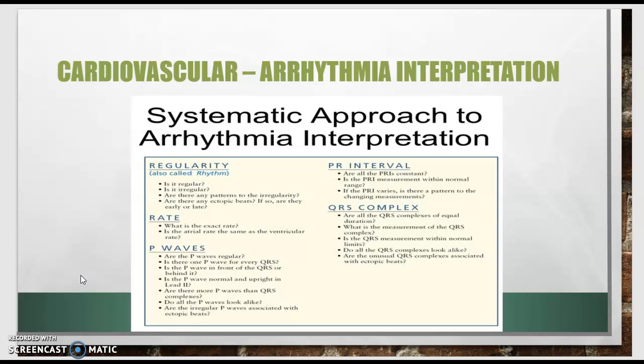Then you want to look at your P wave. Is your P wave regular? Do you even have a P wave? Do they march out? Is there always a P wave in front of a QRS? But here are a list of things that you always want to look at regarding your P waves. And remember, your P wave represents the atrium.